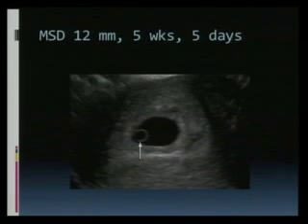Okay? The gestational sac is this, the yolk sac is this. Just by eyeballing, you can tell that the yolk sac occupies no more than 10 to 15% of the gestational sac. Right, Ibrahim? Right, everyone? So just by eyeballing and seeing several of these, you will be able to tell the yolk sac is abnormally large. When it starts to occupy 50% or 80% of the gestational sac, then that's a problem. So the yolk sac measurement should not exceed 7 millimeters. Does that make sense? We don't typically measure it all the time because usually by eyeballing it looks okay.